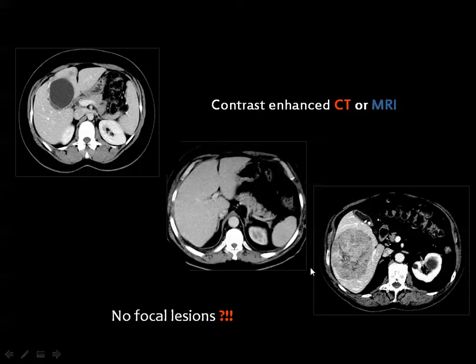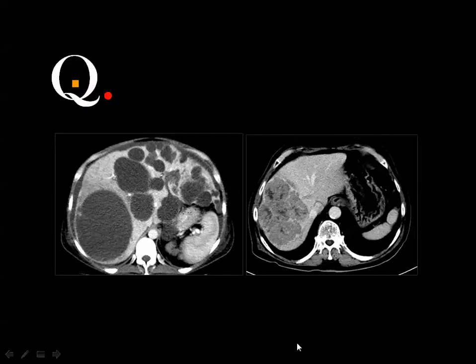And this patient, of course, has 2 renal cysts, and you can see also multiple radiopaque stones within the gallbladder. Then if you look at this example and you see fluid containing lesions in the liver, you know these are cystic lesions, and most of the cystic lesions in the liver are benign. And if you look at this example and you see a solid lesion, most of the solid lesions in the liver are malignant. I will discuss this in detail in the lecture of hepatic imaging.